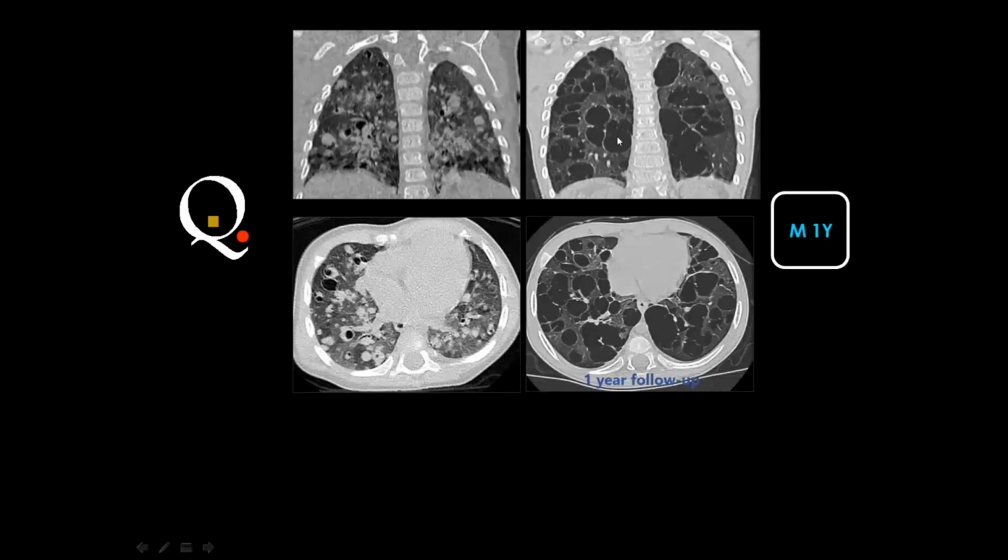No, this is not cystic fibrosis. Actually, cystic fibrosis does not start like this, and this is also not a cryptogenic, no. Hydatid cysts, no. Wegener, no. CCAM or CBAM, no. Yes, this is the right answer.